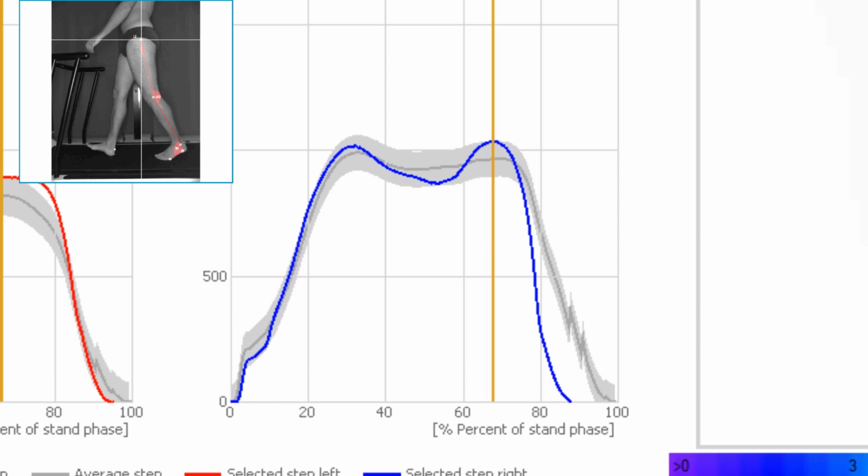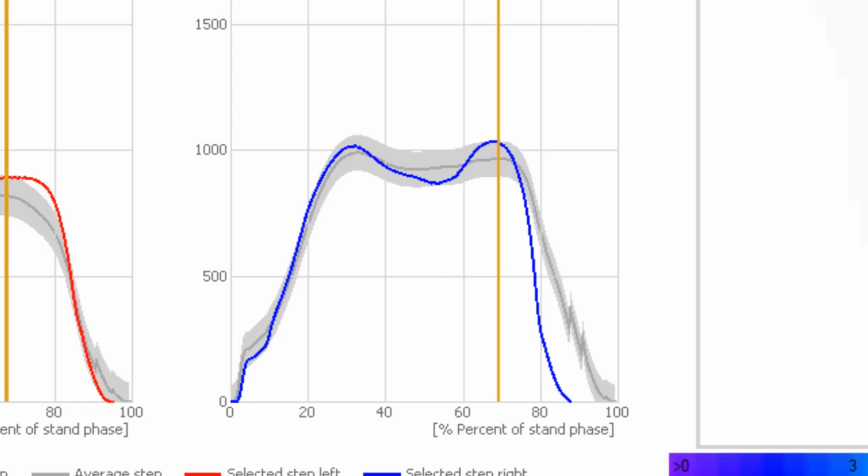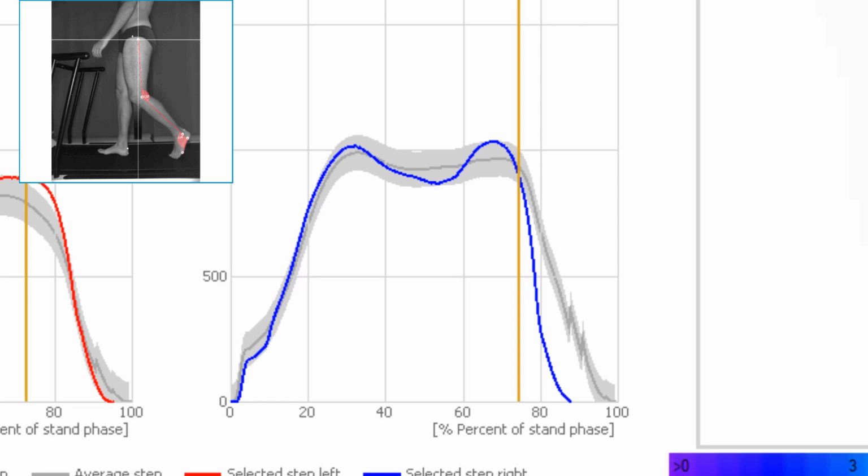At the time of maximum force, the contralateral foot hits the ground, the single support phase is ended and the pre-swing begins. Here, load is successively transferred to the contralateral foot and the force curve decreases completely at the end of the contralateral loading response.